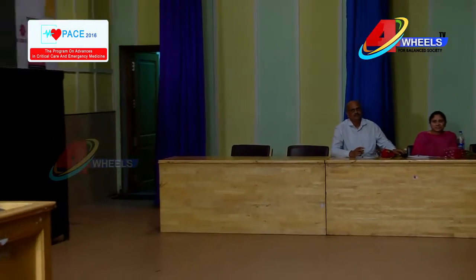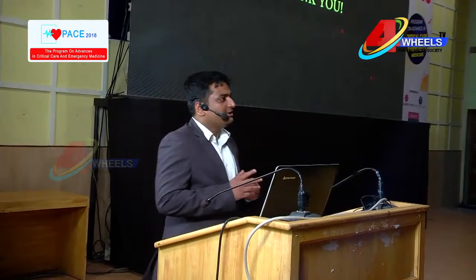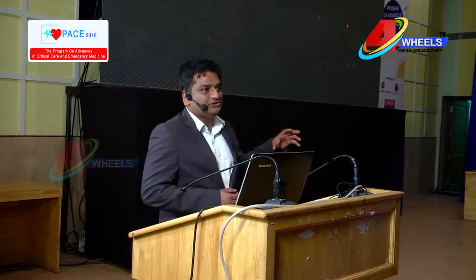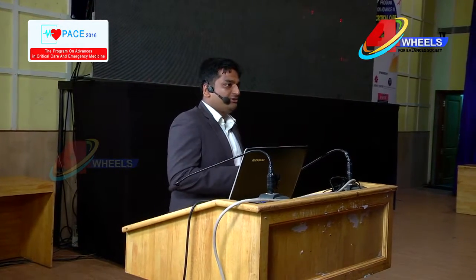I believe most of the things are basics here. I have not gone into detail. The take-home message will be how to identify the anatomical structures and a few life-threatening lesions like EDH. The second important thing I want to tell you is that acute stroke patients will not show this kind of hypodense lesions as you saw in the CT. Generally, CT is used only to rule out bleed before we thrombolyse acute stroke.